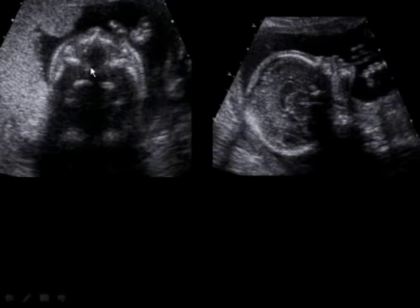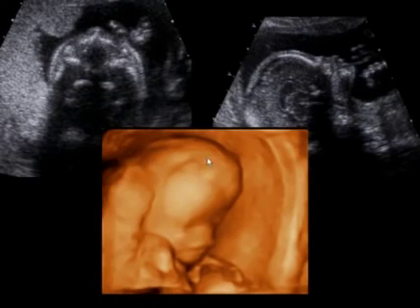Here's another patient, again, looking for the orbits. This is the axial view of the head, and this is the region of the orbits, but we do not have the well-defined bony structure of the orbits on either side, and the nose is very flattened. And on this profile view of the fetus, you can see the chin and the lips, and notice that the nose is completely absent in this fetus. And here's the 3D image. You can see a prominent forehead and just collapsed soft tissue areas where the orbits should be, and no visible nose. And indeed, this child was delivered at term with no nose and no orbits.